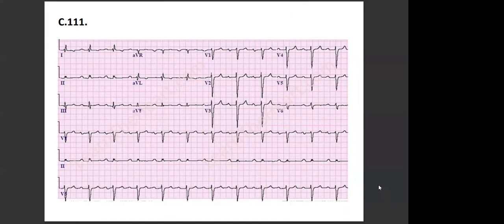Basically, the rhythm is rhythmic, and you can see here the heartbeat is around 75 BPM. Due to positive lead 1 and positive AVF, we have... okay, lead 1 positive, AVF negative is normal. Okay, that's normal. I would say normal. So the AVL is equiphasic, but lead 1 is closest. So the range is from 0 to minus 30 degrees. No. It cannot be minus because lead number 2 is positive. So that's in the normal range, but it can be around 60 degrees or so. Okay, because the sum is positive.